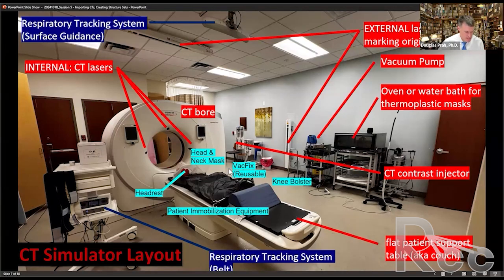At our site, in the past we've used what was called an alpha cradle, but basically it's a polystyrene cradle. But we stopped using those. We prefer to use vac fixes that are reusable and we can wipe them off. So you'll see here we actually also have a vacuum pump, which basically just sucks all the air out of this bag, but it's very helpful in repositioning a patient. And we normally index this to the couch. And you'll see on here the couch has all these various index marks, and we'll make note of that.